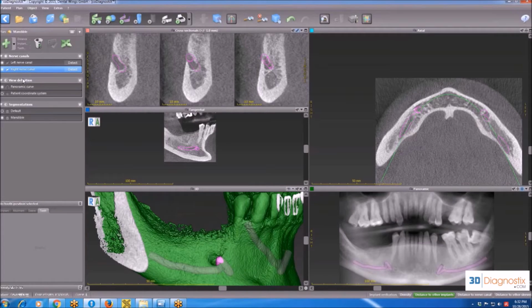Right before placing implants, the reason why I take my time and place virtual crowns is because virtual crowns make a huge difference by helping you visualize the emergence of the implants. Sometimes you place implants in the long axis of bone and you have good bone support all around, and you think everything is all right, but once you place the implant, clinically you realize that your emergence is too far and requires custom abutments. And that's why I always take my time and add virtual crowns.